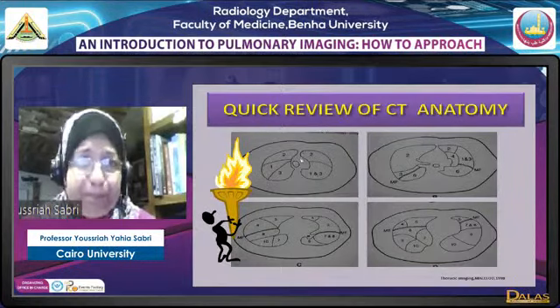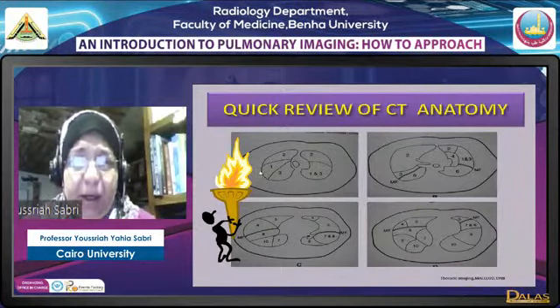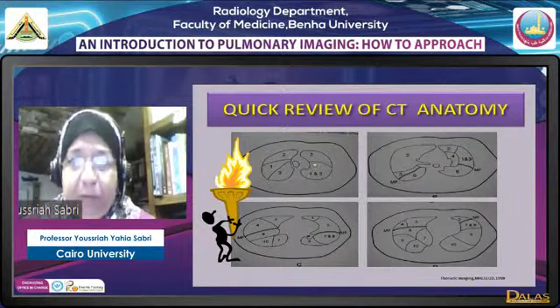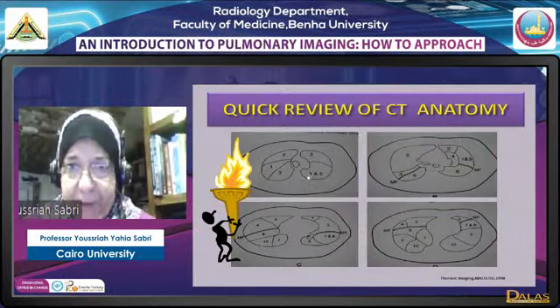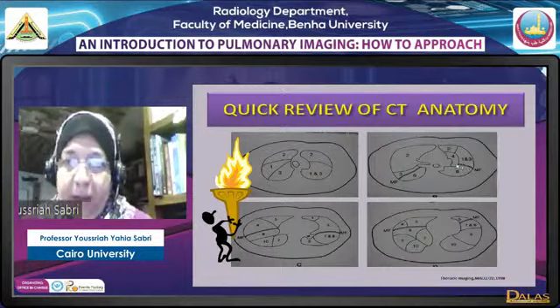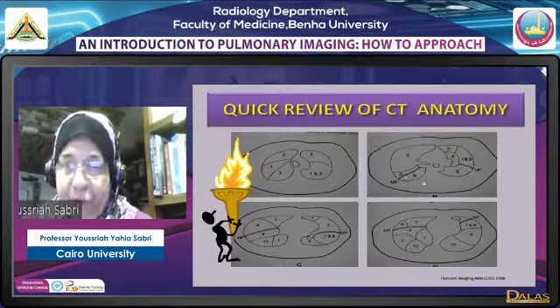Then I have بعد كده عندي الupper lobe anterior segment, anteriorly, posterior segment, posterior, and an apical segment in the middle. While on the left, anterior segment and apico-posterior segment. طيب. Then we have the fissures. بعد كده few levels, a few cuts later, we have the major fissure appear.